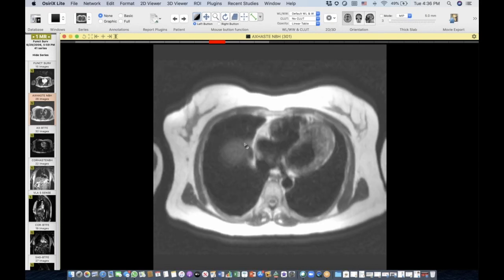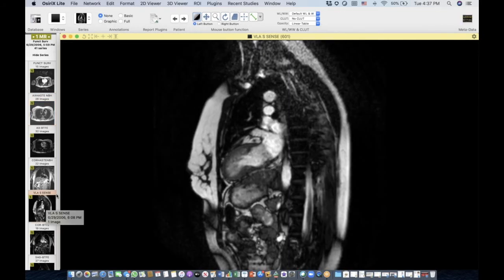I think first of all here, the left ventricle. Any one of the trainees want to try and tell me what's all this stuff here in the left ventricle? Be a non-compaction. Very good. So I think here, this is just a single shot, but you can see some of that non-compacted myocardium. It's quite prominent actually.